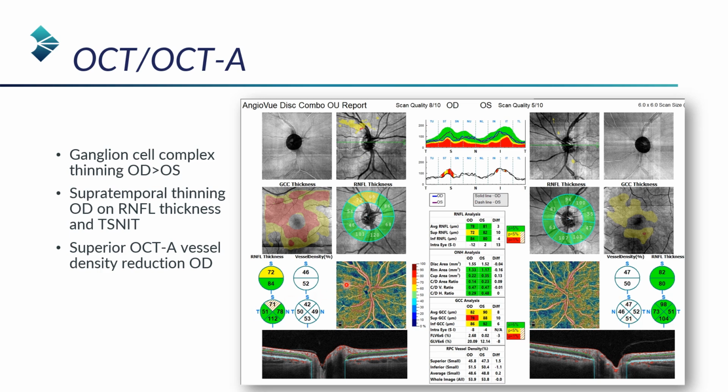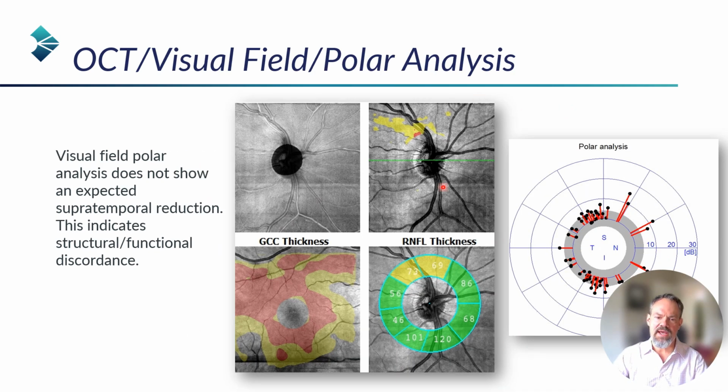And in that supratemporal area, there may be some reduction in blood flow here, so that definitely has my attention. Here is a blown up view of certain parts of our OCT report, and to reiterate, my suspicion lies in the supratemporal area based on this being flagged and some asymmetry superiorly versus inferiorly in the ganglion cell complex deviation map.